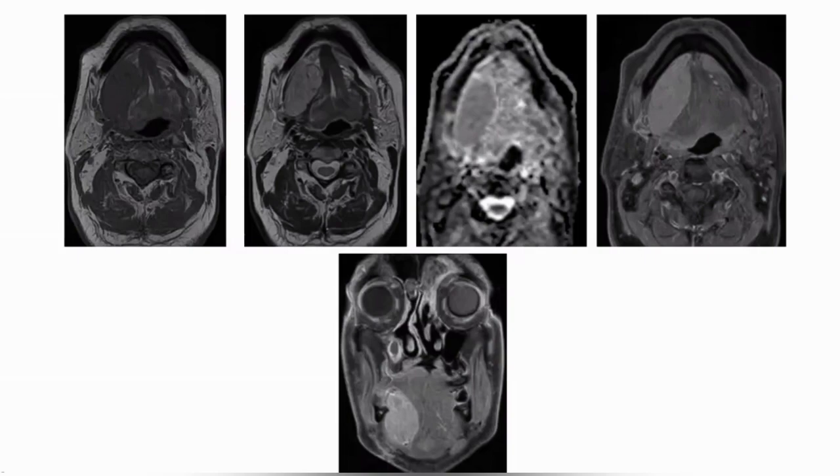Salivary gland can be in this area, and that will be a sublingual salivary gland. Yes, sir. And there is no bony erosion by this mass, and basically it can be adenocarcinoma of the gland. Yeah, it can be a salivary gland tumor. That is actually a more appropriate diagnosis in this particular case.